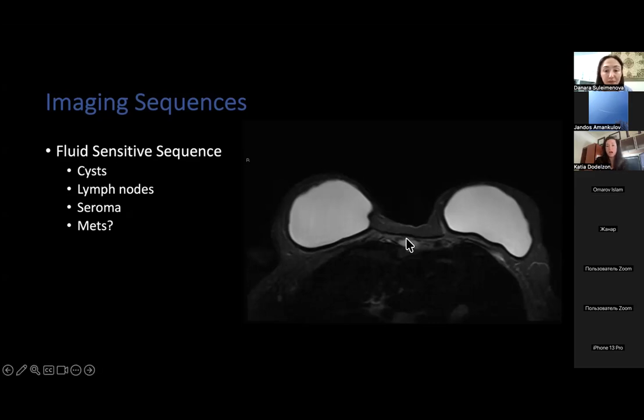This was a patient of mine after bilateral mastectomy for right breast carcinoma. The breasts were actually fine, but unfortunately, she had multiple areas of metastatic extent now, with a metastatic recurrence. I first noticed it, and it was much easier to detect on these T2 weighted STIR images where I saw the abnormal T2 high signal in her sternum. And actually, I'm not showing all the sequences, but in multiple ribs. And this was metastatic carcinoma, which you could see the enhancement of later on the post-contrast images, but it was very, very subtle, pretty faint. It's the T2 signal that really shines through and helps you detect it.